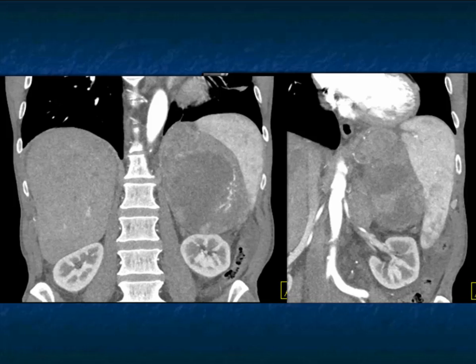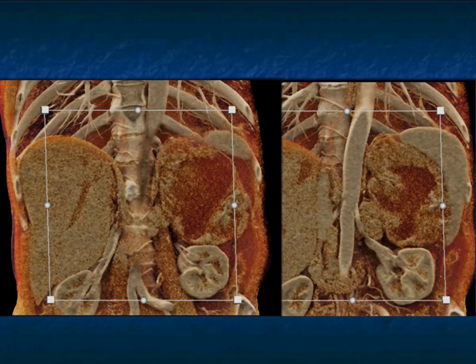You can see on the CT angiographic mapping some vascularity, areas of necrosis, displacement of the spleen and the patient's left kidney. And in the cinematic, it really accentuates necrosis. So one of the things I see with CT angiography, particularly with the arterial phase map, is the ability to look at tumor inhomogeneity and look at tumors that become necrotic.